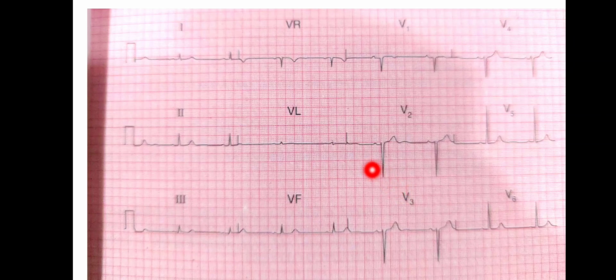So what should we do in this case? We can repeat the ECG to ensure that the chest leads have been placed properly. We can also proceed to an echocardiogram or chest x-ray of this patient to see if left ventricular impairment is responsible for the changes or the symptoms with which the patient presents. Thank you so very much.